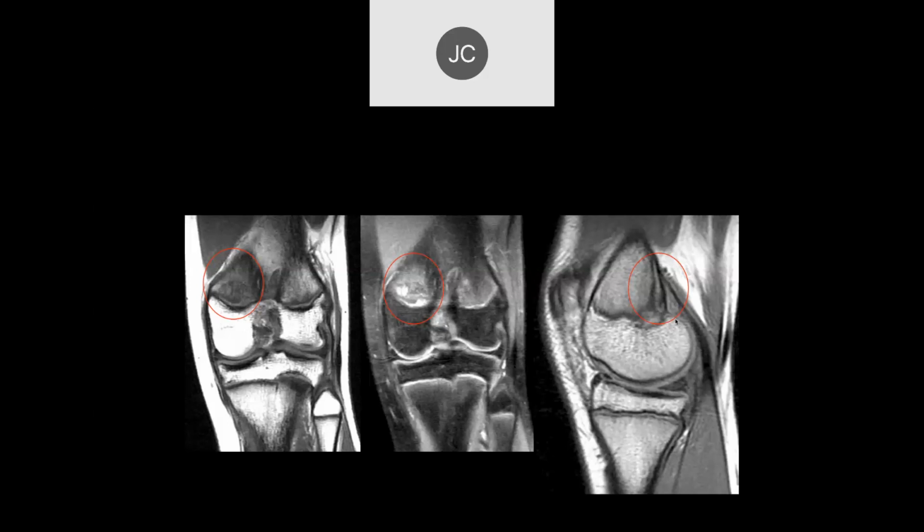These are pretty common. They may or may not be symptomatic. That really occurs posteriorly here in the metaphysis, and these have various names. The most common one is a cortical desmoid. And what is this due to? Traction from the medial gastrocnemius. So this is a traction reaction within the subcortical bone here due to traction from the gastrocnemius.